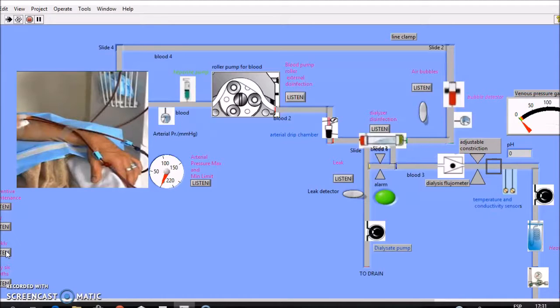Audiovisual check. Check connections for leaks with soap solution and drain off. Check all fittings for proper assembly. Replace any deteriorated hoses and tubing. Every 6 months, cleaning and disinfection. General cleaning of the external part, external modules, and electronics.